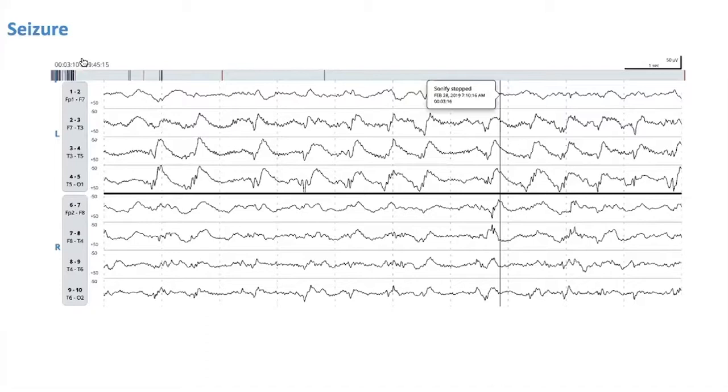So would you say that explains why you're seeing this type of activity on the other side of the brain, even though you don't have seizure on both sides? Primarily, you're basically hearing the explosions on the left, especially the posterior channels, from the right side as well. Yeah, exactly. So one doesn't have that anatomic precision of the EEG. You're looking very broadly, and that's okay, as long as you know what you're doing.